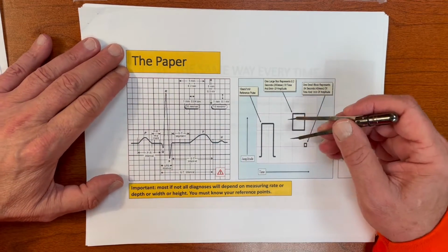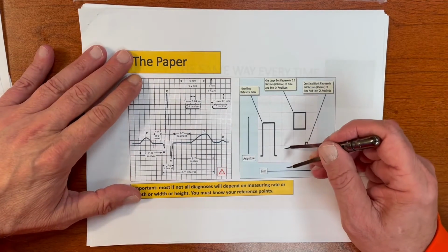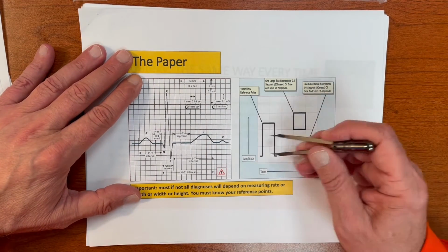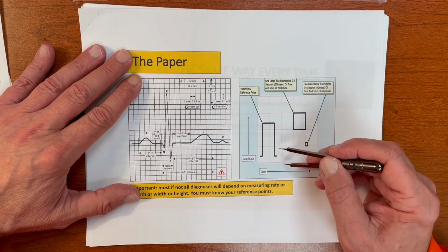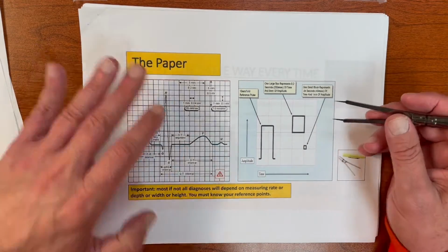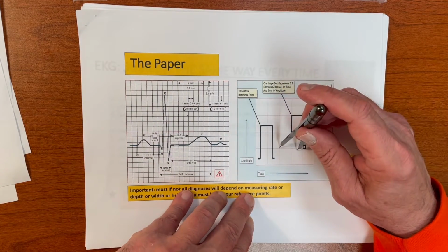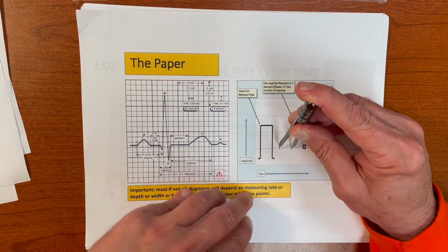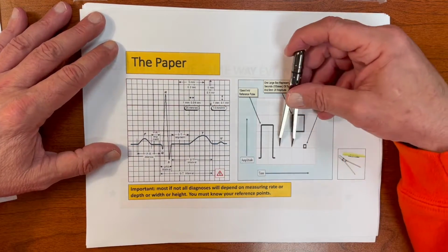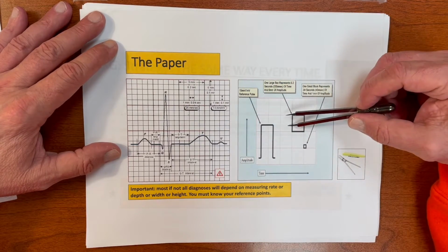All right. So what we're going to be doing, let's say voltage. We'll think about high voltage and like LVH. Well, we're going to be measuring amplitude, okay? Vertical axis. So we'll see how many boxes we got, small and large. Meanwhile, time-wise, we're going to measure, let's say, a PR interval. And we want to make sure it's less than a large box. Well, we're going to set our calipers to that and then measure from the beginning of the P to the beginning of QRS. So this is how we're going to be using our calipers, okay? This is what this tells you.